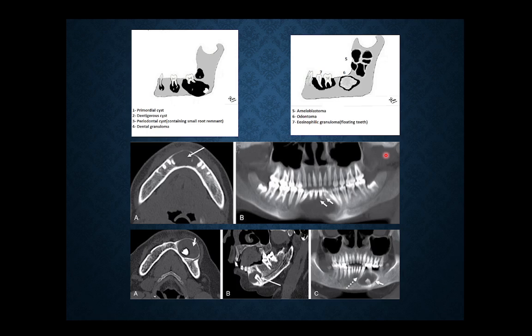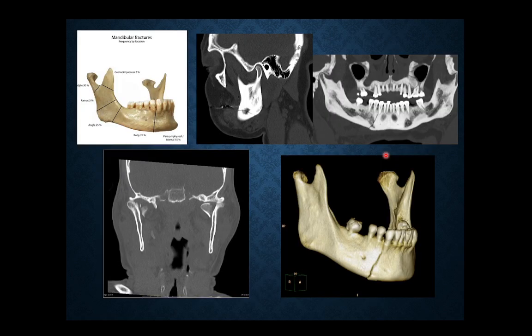Okay, regarding the mandible, like the skull, we can have fractures. We can have simply root canal abscess or apical cyst, ameloblastomas, multiple myeloma, brown tumors, dentigerous cyst, which is involving the crown of the tooth, temporomandibular joint dislocation. So we can have multiple pathologies related to the mandible and TM joints, apart from rheumatoid arthritis and other arthritis and dislocations. So this area is important.